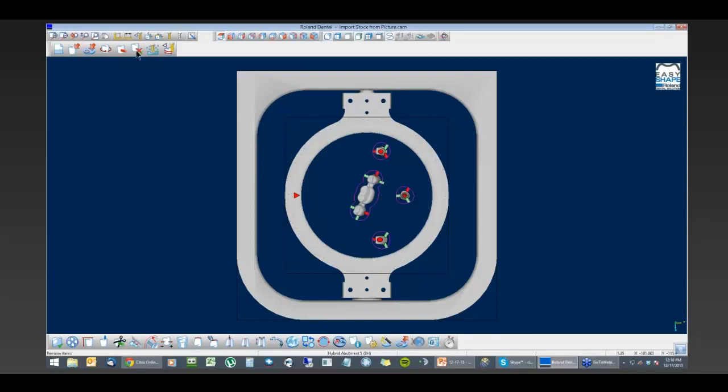Well, this particular stock, let's say that I have a stock that I've milled out of before, and I have a picture of it. You can take a picture with your smartphone, point and shoot camera. Really doesn't matter the resolution. You probably don't want to go as far as to get too high of a resolution with the DSLR. Larger photos may take longer to load, so it really is not necessary.